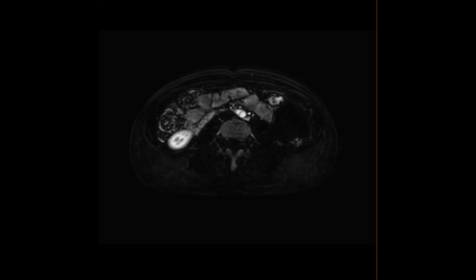At least the lymphangiomas that I've seen have been multilocular or septated. And so I thought this could be, and the colonic duplication cysts are important because they're rare.